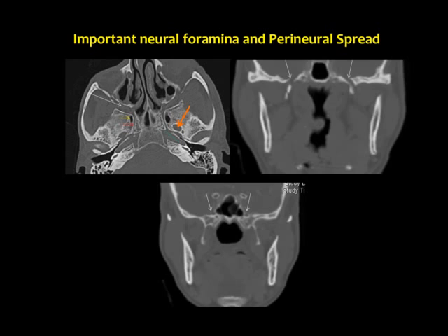Foramen lacerum. So let's identify: the oval structure is the foramen ovale. Posterior to that is the foramen spinosum, and the L-shaped longitudinal foramen is the foramen lacerum. What is the content of the foramen lacerum? It is closed inferiorly by a cartilage which holds the internal carotid artery. And if it is deficient, it can lead to what? It can mimic which particular malignancy? Glomus. Yes. If there is no cartilaginous floor, it can mimic a glomus tumor, with pulsations seen in the inner ear.